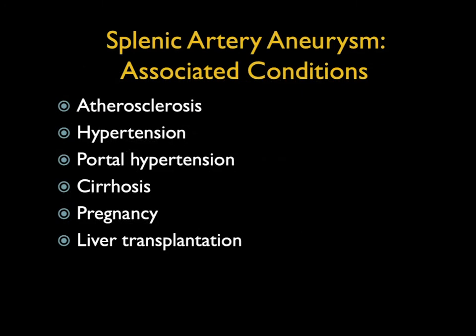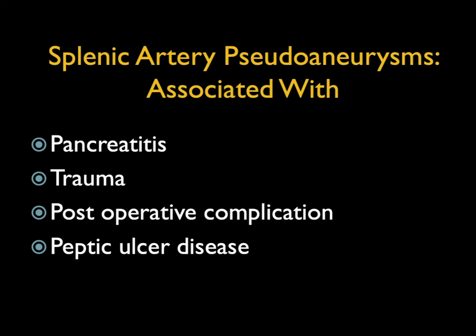They're most commonly due to atherosclerotic disease, but we also talk about hypertension and portal hypertension. We talk about cirrhosis. We talk about liver transplantation and pregnancy. Splenic artery pseudoaneurysms, on the other hand, most likely are due to pancreatitis. It won't be the first episode. Multiple episodes of pancreatitis. The pancreatic fluid erodes the vessel.